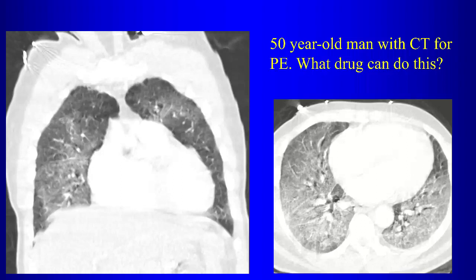We have bilateral diffuse ground glass opacity, right? It has a very broad, long differential diagnosis. The first thing you might start with is, what's the first thing? The differential for diffuse ground glass opacity. Pulmonary edema. Good, right, sticking with the topic of the lecture, nice work. So what drug might give you pulmonary edema? Opiates. Yeah, absolutely. Here in Newark, we see quite a bit of this, right? So opiate overdose can put patients into pulmonary edema. That was the case here.